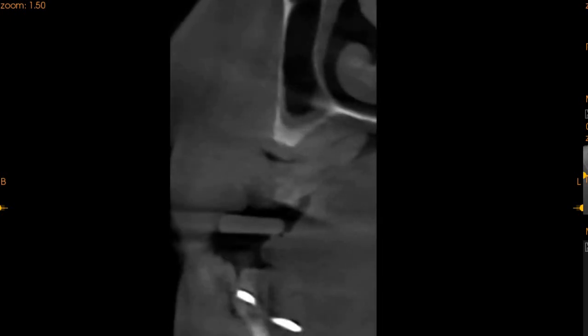Moving to the upper left premolar region, this region does not have sufficient bone. We've got 3 millimeters of ridge width with approximately just 6 millimeters of ridge height. Moving to the second premolar region, again very small ridge here, very atrophied ridge here. The molar on the upper left hand quadrant has good bone support on the mesial side, has very minimal bone support on the palatal aspect.